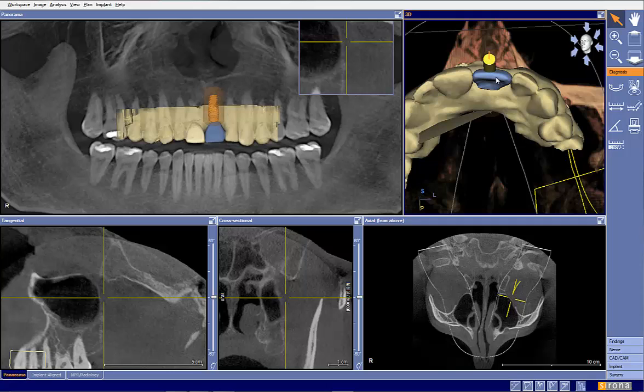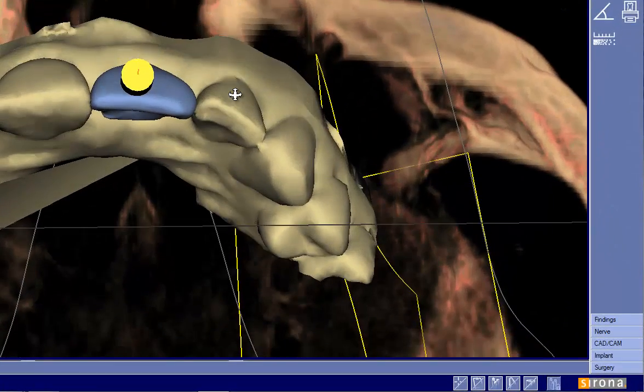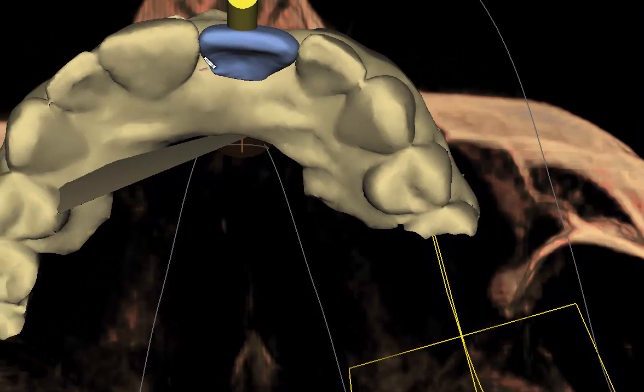again, when we're nitpicking things. To me, the goal is to have ideal placement, ideal planning. So I would like to see, in this particular case, the restoration planned out a little bit better. Just to give us an idea here, I would like to draw out where we could, retrospectively, have drawn our margin. So maybe in the future we could draw our lingual margin probably something like that.